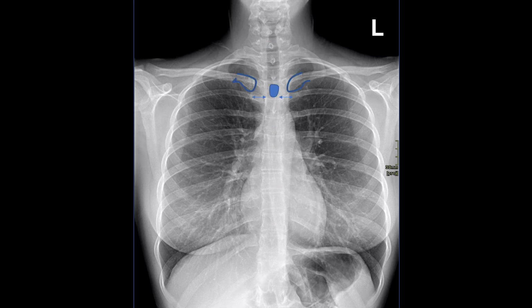If you want to assess and see if the patient is rotated or not, you want to take one of the spinous processes that you can see well, and also look at the proximal heads of the clavicles on the left and on the right, and then look at this distance. So in a patient who's very well positioned along the midline, who's not rotated, this distance between the proximal head of the right clavicle and the spinous process is the same as for the left head of the clavicle. If the distance is widened, that tells you that the patient is rotated to that side.